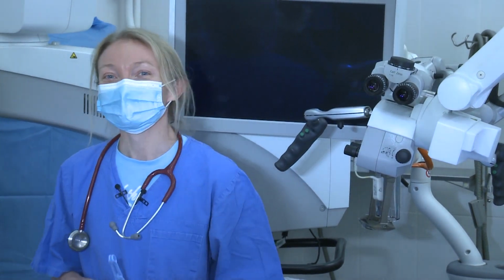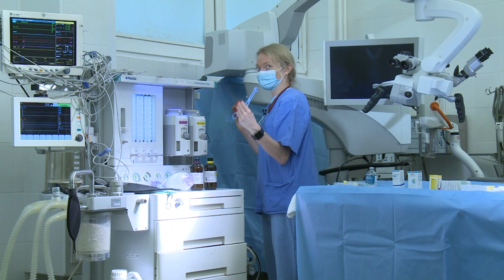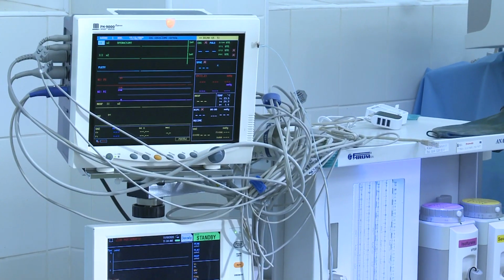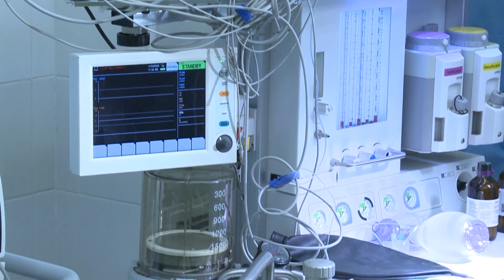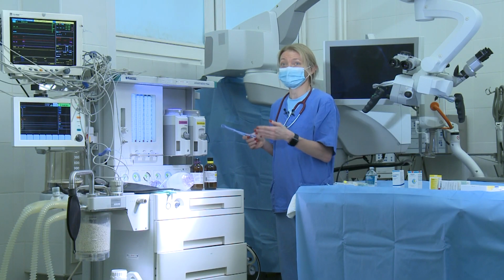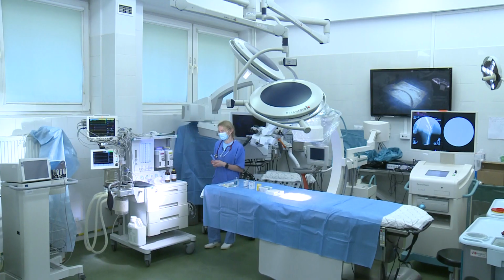Hello everyone! Today I would like to introduce you to this mystery machine called the general anesthesia machine, which allows us to proceed with inhalational anesthesia. Today I would like to tell you about the basics: how it's built, how it works, what kind of elements are inside the machine, and for what kind of patient we are going to use it.